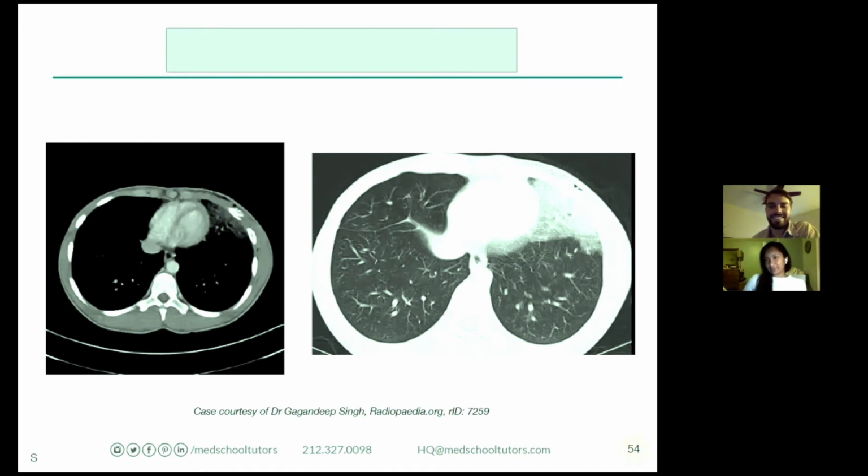All right, we got another one. So this one I'll give you. Patient is a 38-year-old man who is coming in after a motor vehicle accident. And then they get a pan scan because they were in an MVC. So what am I looking at here?